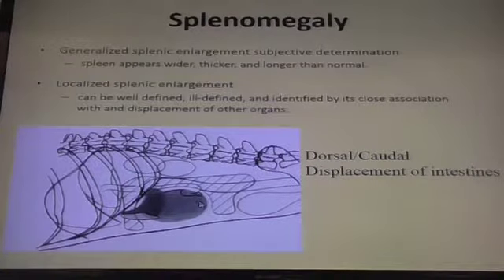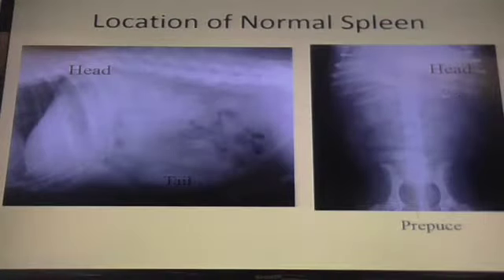Okay, question. For the triad, you said it was the head of the spleen, the left kidney. The fundus of the stomach, head of the spleen, and left kidney. Thank you. That's the triad in the upper left. Because sometimes when you look at ventral dorsal views, you don't know where structures are. Your eyes have to adjust to those layers. If you know where one structure is, you know you have to look medial or lateral to find the other structure in conjunction or connection with each other.